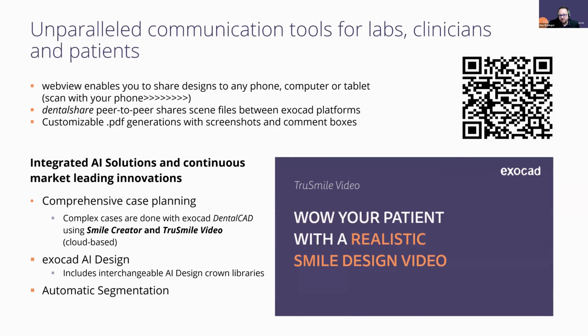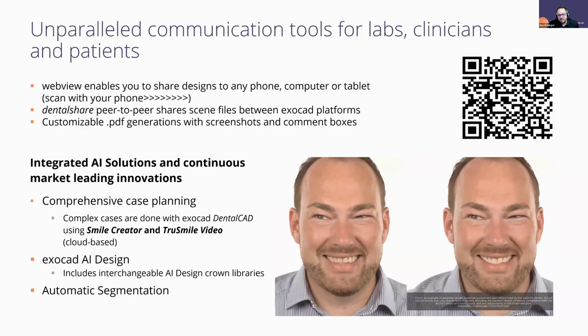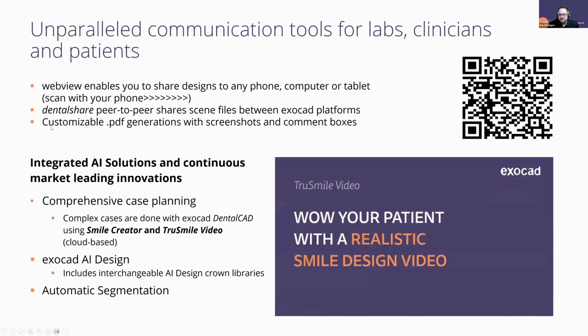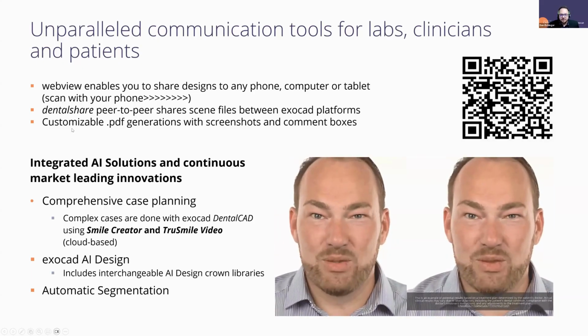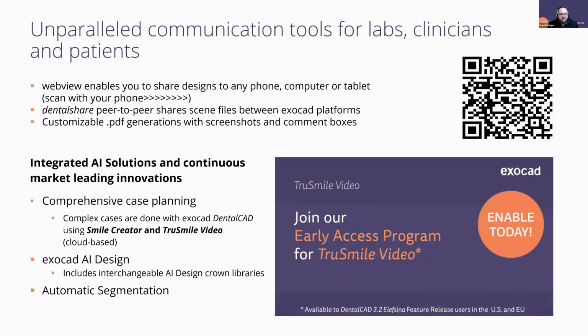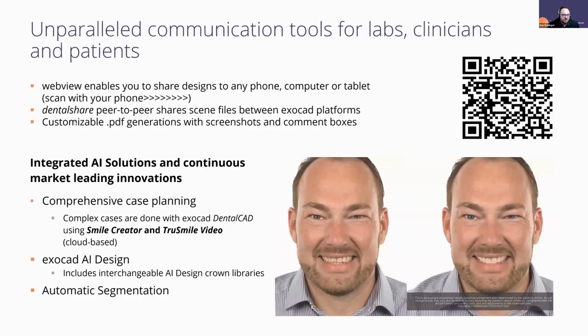You can edit those screenshots, add in text, or, we'll say, certain shapes, maybe arrows pointing out a specific situation that you want your customer to visualize when you're having that communication back and forth. So there are so many options when it comes to communication and getting that feedback you need to proceed with the restorative options that you're designing.